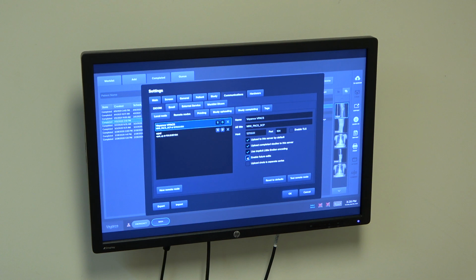If you're just setting it up and you want to use the viewers as simply a way for the providers to view the image, but no changes that they made would be applied back to the original image, then you would uncheck this. However, you would want to check the burn measurement tools and the burn the patient information and labels. We want to select those so that any of the annotations we did, like left or right marker or text notes or anything like that, would go with the image to the third-party PACS.